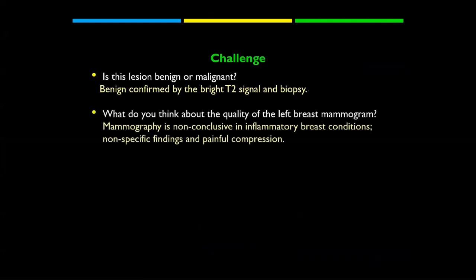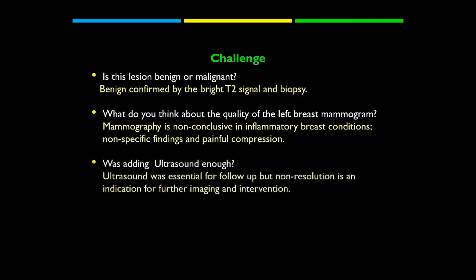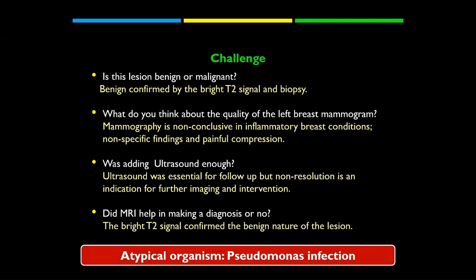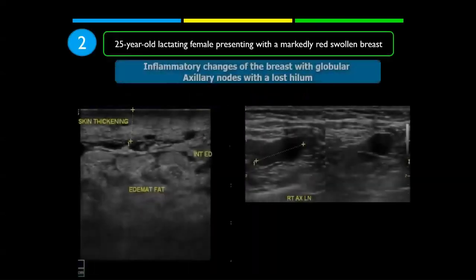What do we think about the quality of the mammogram? Definitely it is a very poor quality. The patient is young and she has mastitis, and the compression is painful. Was adding ultrasound enough? It was good for follow-up, but it was not conclusive in the diagnosis in this case. And actually MRI made us more content with the pathology report of a benign inflammatory mastitis, and this was a case of atypical organism due to Pseudomonas infection.